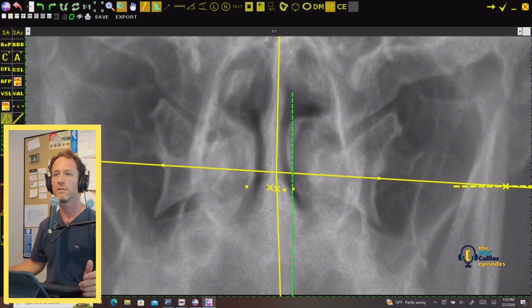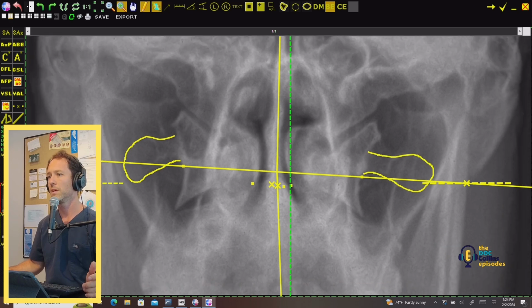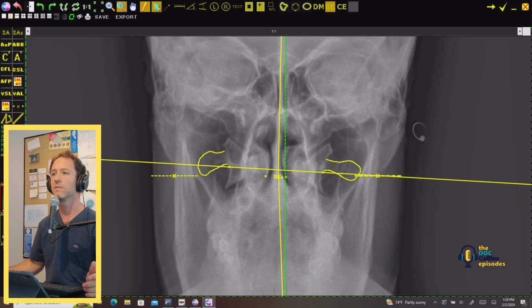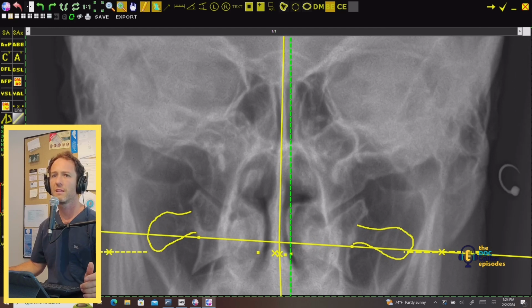So just crossing T's and dotting I's. Where's that transverse process? And the one on the right. This is kind of how I button mine up. And then mastoids. With our procedure, there are slightly different angles. AO is this way as well.